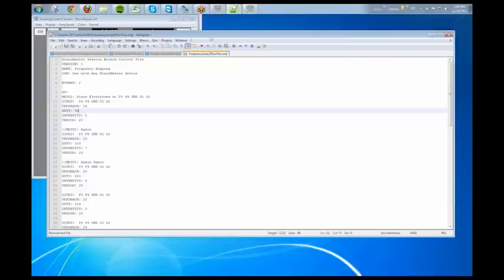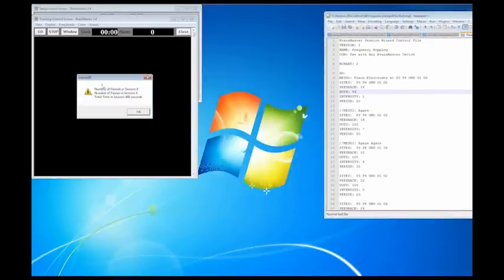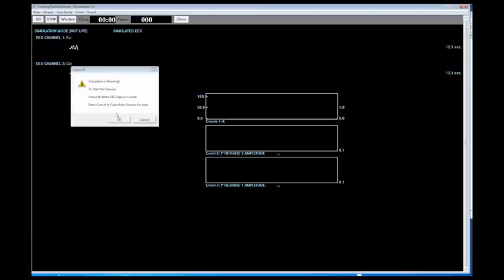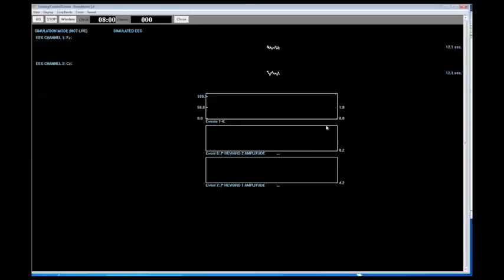So let me launch that. Let me get this over here so that we can follow along. All right, as you can see, there's 8 periods in this one, 8 pauses, 480 seconds. Even though I don't think there are any pauses, but that's okay. It says that just because we get to a period of time breaking. So we're starting off. You're seeing nothing really started off right here. So let's hit OK.